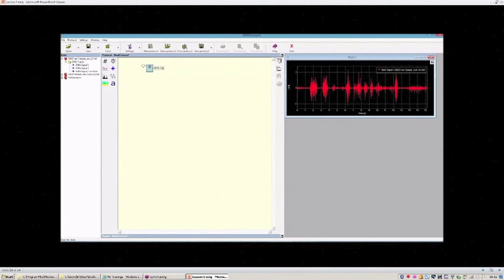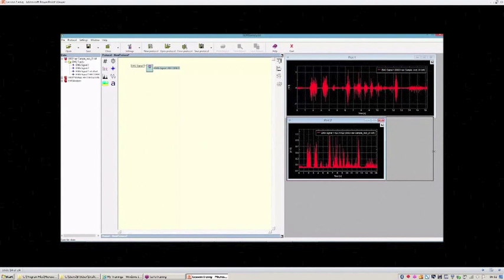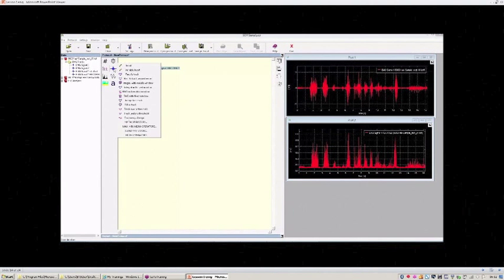You have to type the name of the output, for example, EMG signal 1 rectified. And then to perform the rectification, you just have to drag and drop the signal into the operator input. And this is the result. As you can see now, all the values are positive.